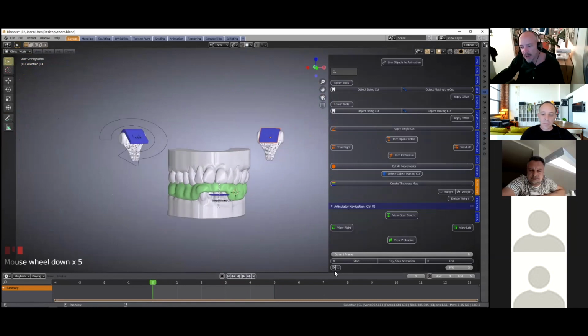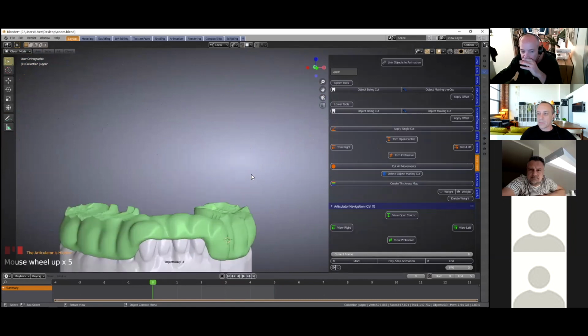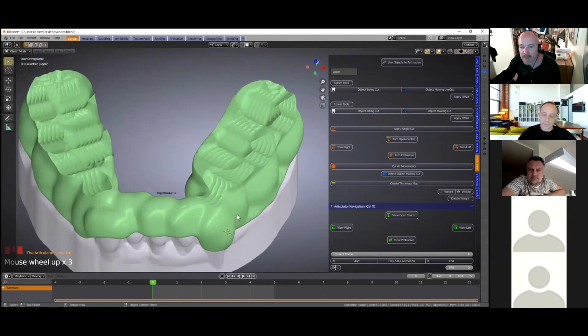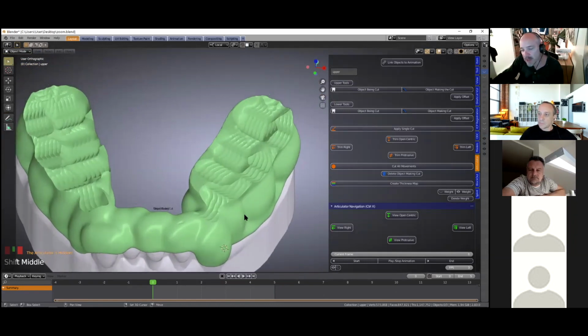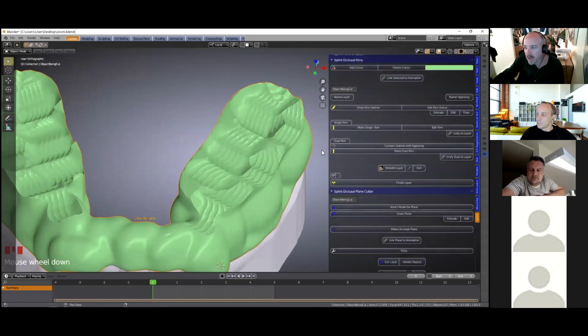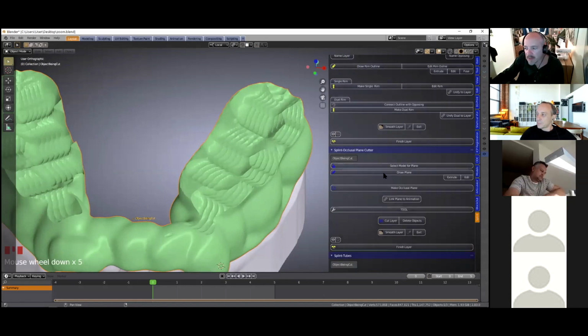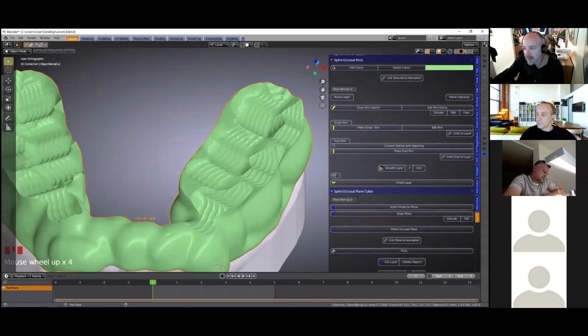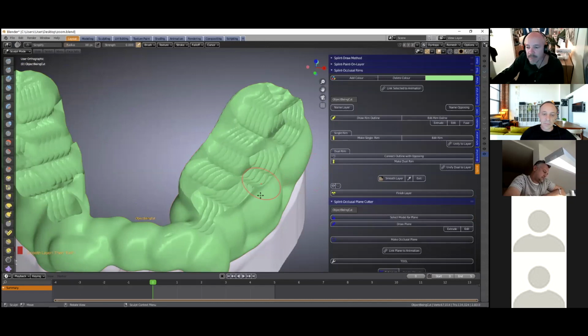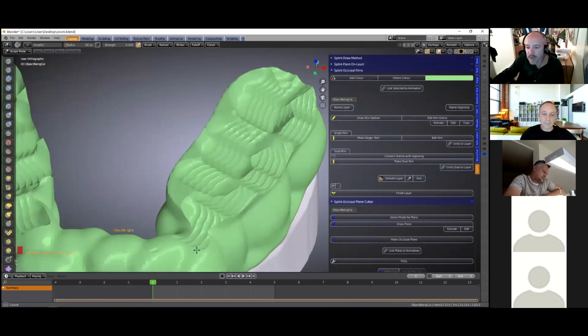So then what we would do, we don't want to print it like that, because we're going to be polishing by hand for a whole hour or something. So we can polish that on the computer. I'm going to just use any one of these smooth layers. There's quite a few. So click on smooth layer, and then we will just smooth it.